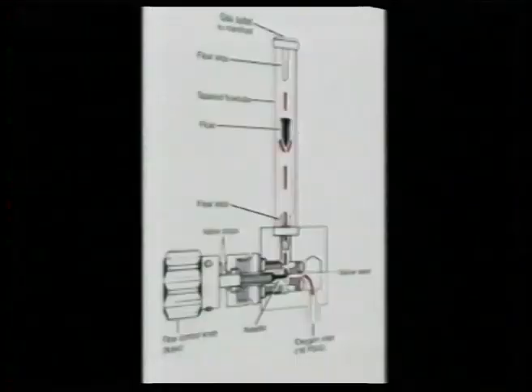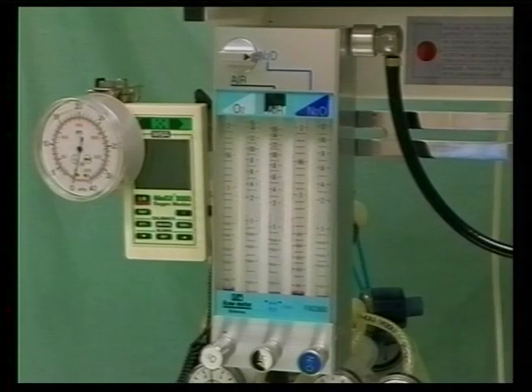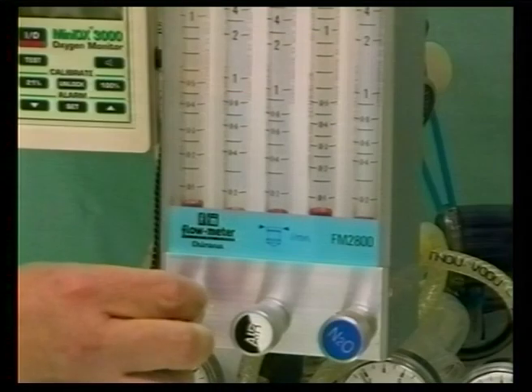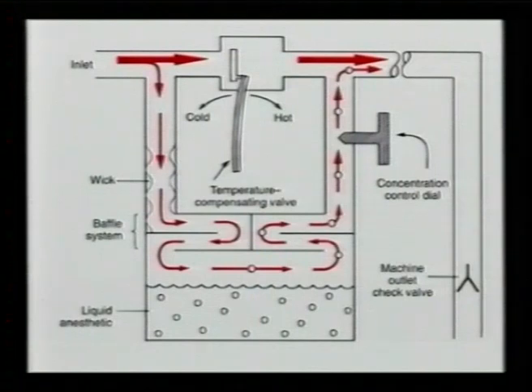The dosing devices for gas anesthetics are flow meters, glass cylinders which widen upwards. The level of gas flow in liters per minute can be read on the calibration scale against the upper level of the indicator. Volatile anesthetics are supplied by high accuracy vaporizers. A sophisticated construction of them enables to keep a constant concentration of the volatile anesthetics independent of the surrounding temperature.